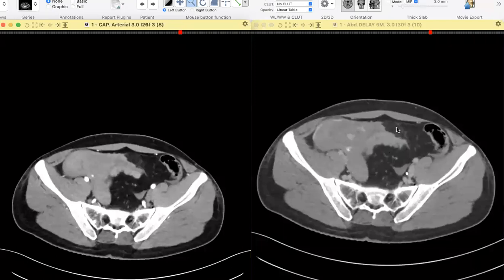Diagnosis of the last case, I don't know which case that was. So can we give the differential of undescended testis in this case? Neoplasm and undescended testis, it won't be so high. I don't agree with undescended testes. If it were a little lower, probably paravesical or near the aortic bifurcation, I would still say, okay, it could be an undescended testis, but you have to go with most common first. It's lymphadenopathy. And suppose you don't have the history of operated testis and you're only seeing one testis, then maybe you can raise that possibility. But more likely would be a previously operated tumor in the testis.